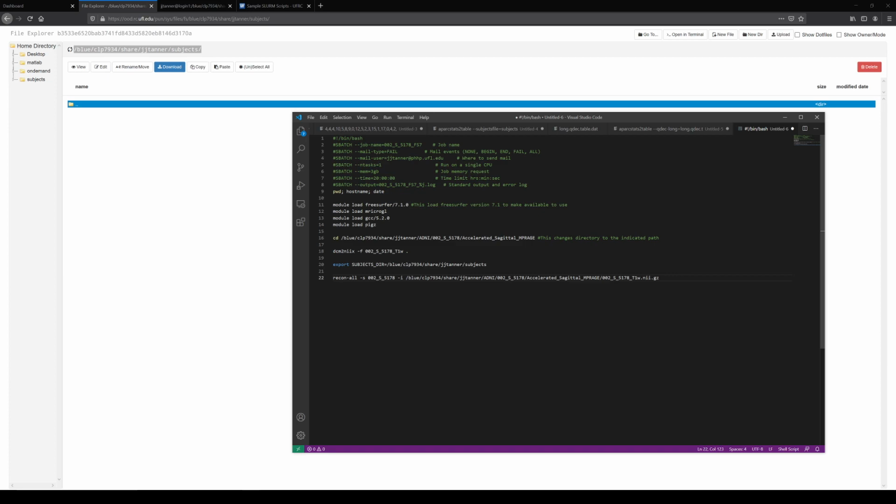And I've stopped testing this live because while DICOM to NIfTI would be pretty fast, I'm just letting this run in the script. And I'm just going to assume this is all going to work. And then, so we set this as a subject, we have an input, and then we have all. It means run everything. And then that's going to be it. And then at the end, I'm just going to put date. And so that will save the script when this finishes.